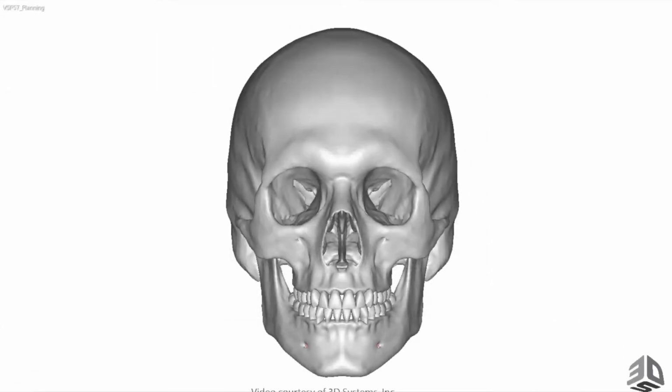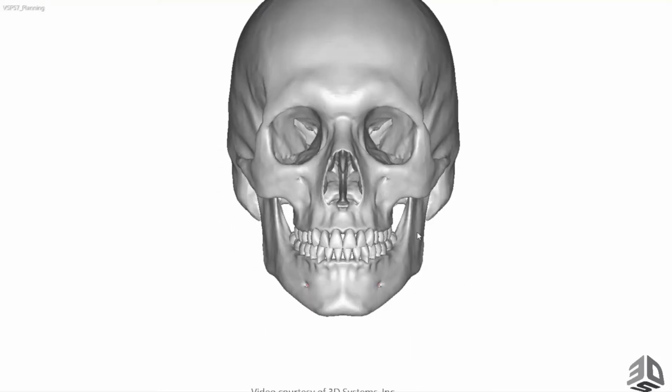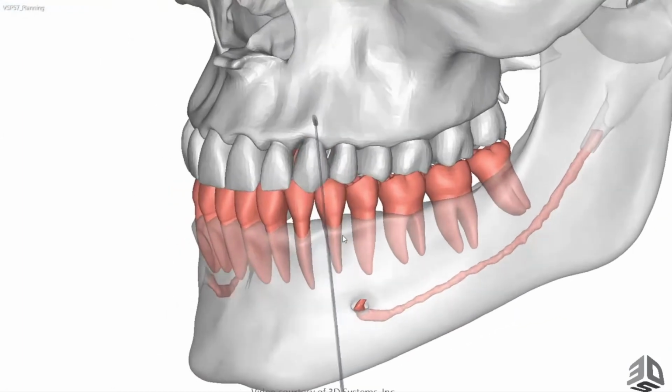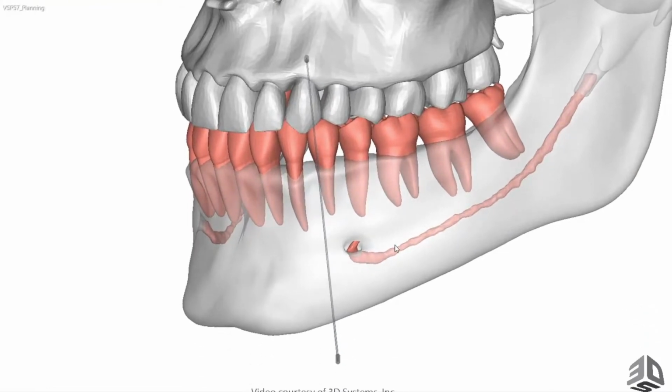Just so, James, I'm going to go through the whole process. You will have received a prescription or an instruction of a left-sided mandibular resection from the angle of the mandible to the canine region. So if you can start marking up the resection onto an anterior resection between the canine and the premolar, please. Okay, absolutely. Something right about here. Just bringing that resection a little bit closer to the premolar to try to save that canine. Yep. So that's the first important point for the delegates.